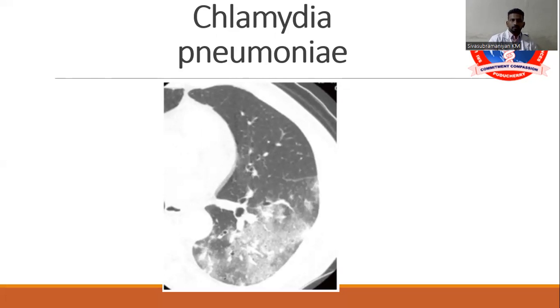All right. So contrast that with this, and you see that there is much more definition of ground glass density. You can still see the bronchial markings, vascular markings through the density. So that is the hallmark definition of a ground glass density. You can clearly see the bronchovascular markings through and through the haziness, and you can see that it is much hazier compared to the previous one, and it is much more localized and much more well defined and confined to a particular lobe of the lung.